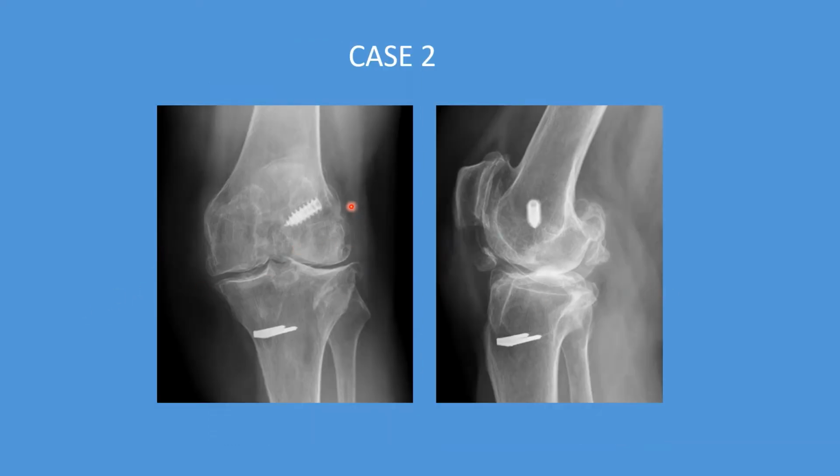Okay, here we have another arthritic knee, bone on bone, subluxation, flattening of the condyle, but very importantly, prior ACL repair. Now, this is a slightly different method of fixation. There's still an interference screw in the femoral bone tunnel, but here we see a staple used to secure the graft. Okay, so the first thing that we're going to do is make a 3-dimensional model to see what is in the way and what needs to be removed. Let's take a look.